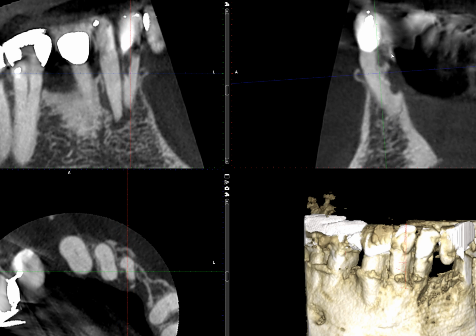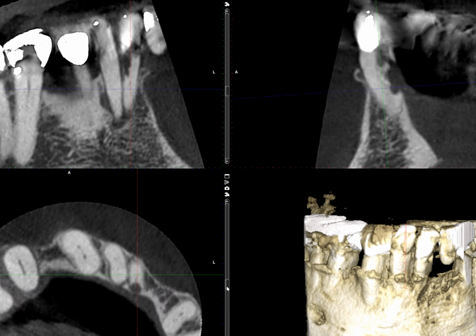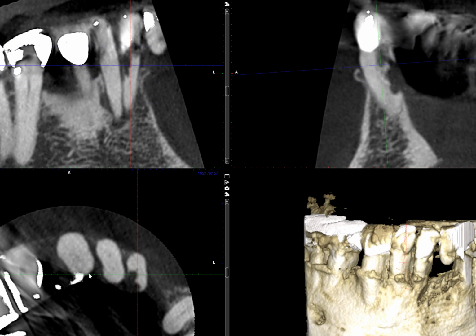There's part of the alveolar crest, but it's definitely perforated. And it's very impressive, to say the least, right? Just look at the amount of resorption that has occurred. So it's best visualized in the axial and the sagittal view. Well, coronal view is still helpful as well.